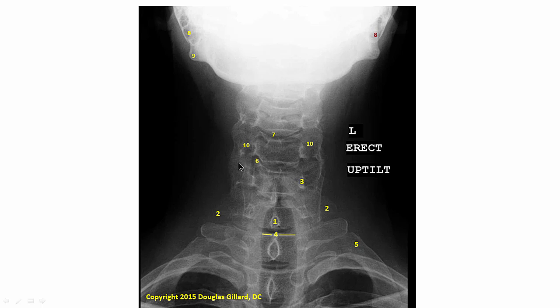So how the heck do you know which bone you're on? Well, you got to count up on this one. So these are obviously the first rib, number 5 here coming around. First ribs, they articulate with these transverse processes. So this has got to be T1. Here's the spinous process. Here's a pedicle. Here's another pedicle. You can see the radiodensity making the pedicles.